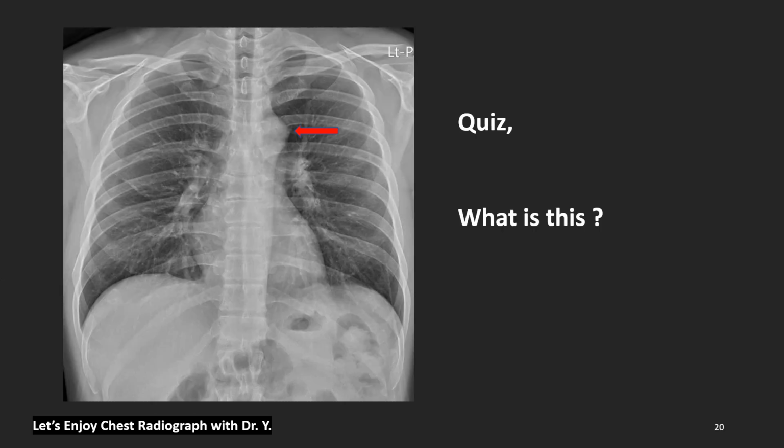This is the quiz for the next session. What is this? What is the name of this and the anatomy?